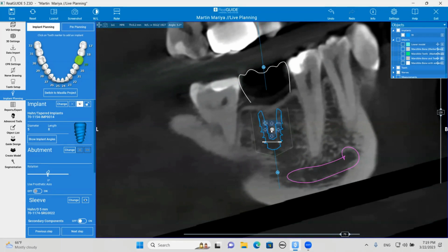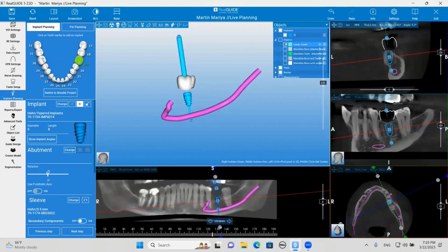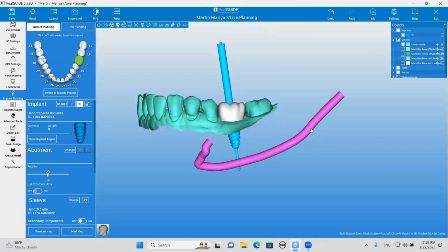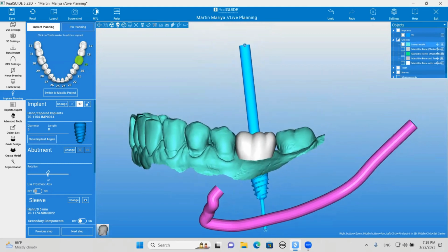Okay, does that make sense? That sounds great. Absolutely. Exactly. So what questions do you have for me on that? No, that's pretty much what we had planned. I just wanted to confirm it with you. My preference is to place the implant and then graft, and at the same time place a membrane. Now, of course, I will decorticate the bone. I am definitely going to do it guided so I can be precise. And the 5x8 is exactly the one that we had chosen. So I think it looks good.